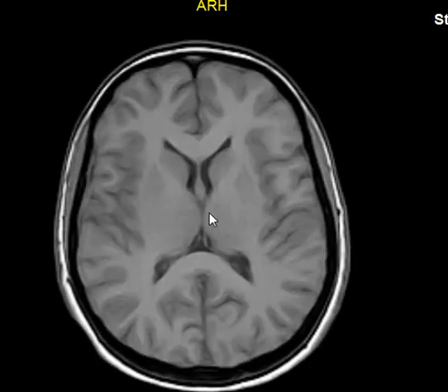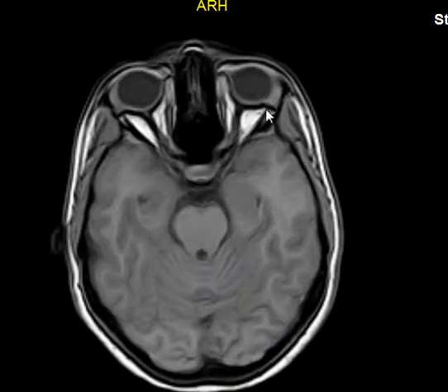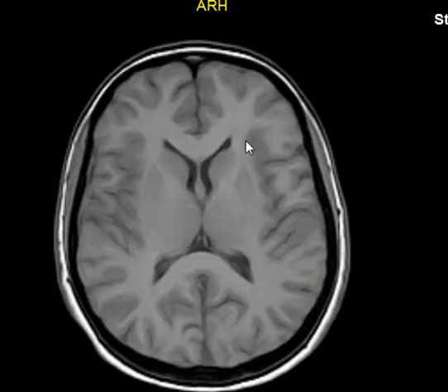This is a T1 weighted image. You can see the fluid, the CSF, is dark. The eye globes are dark, and everything else is white. It's fat, because we said T1 loves fat. So you can see first this layer of white, which is the subcutaneous fat of the scalp, below the skin. You can see this white line surrounding the head. This is the scalp.